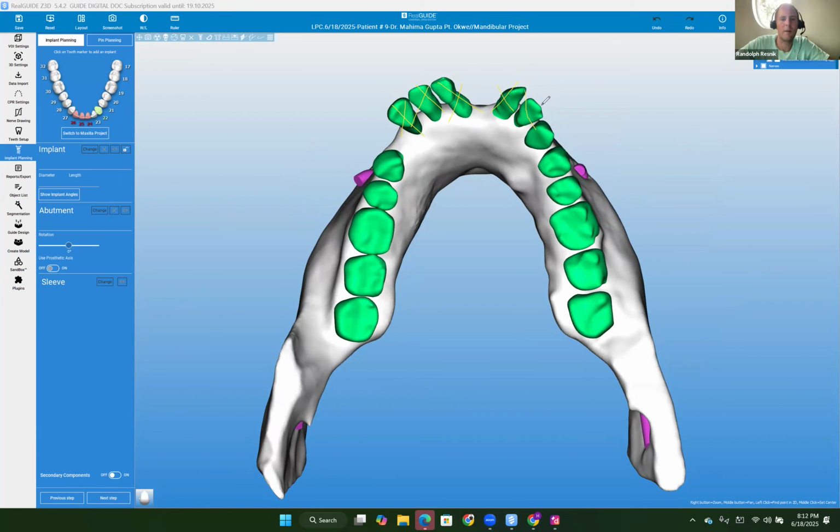So first off, the teeth here, I don't think are in the correct position. They're way too splayed out forward there. So you can't really use where these teeth are for planning purposes because they're so far out of where they need to be. Actually, I submitted another thing. I think it didn't come there.